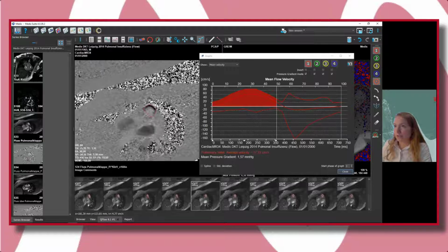Just to check, I'll go over the series again, but I don't see any white spot in here. So there's no aliasing, but just a very low velocity. So also add that one.